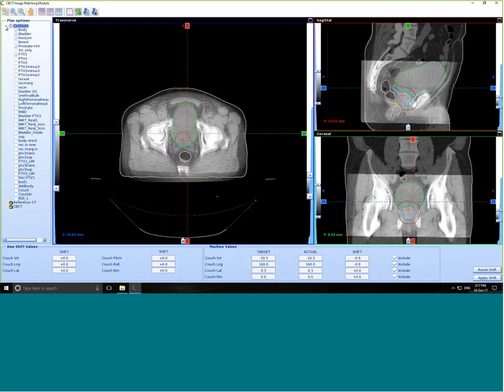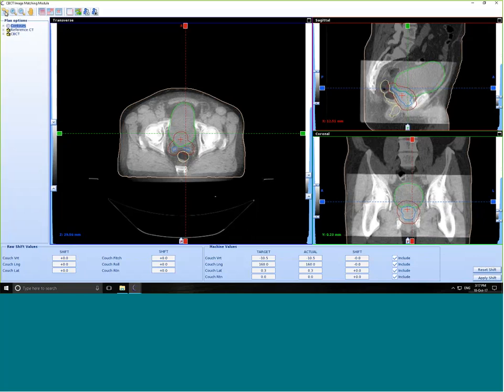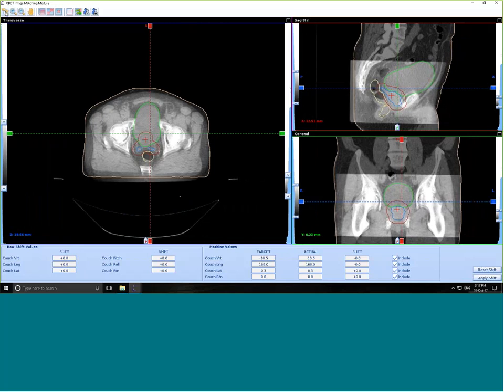So this is again something that's new to the software, being able to load multiple DICOM sets, as in the CBCT, and also the ability to show the contours on the sagittal and the coronal. Something again that we've had to work with to be able to make this function for the CBCT module. To remove that tree, just click the button again, and then that will sink into the left-hand side.